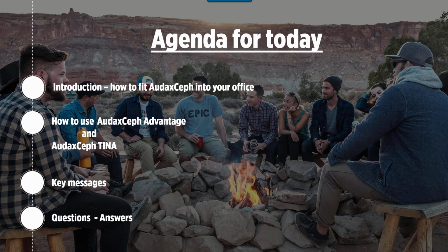We'll make a mix of slides and software presentations. We will play a game with different types of tracing and measure the score. We will show things that you didn't know about the licenses and about the hardware, network sharing the licenses, and so on. Of course, we'll have a quick look at all the modules or major functionalities of AudaxCeph and the future development roadmap.